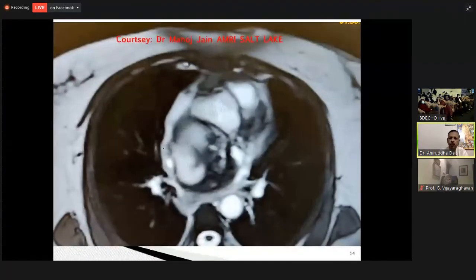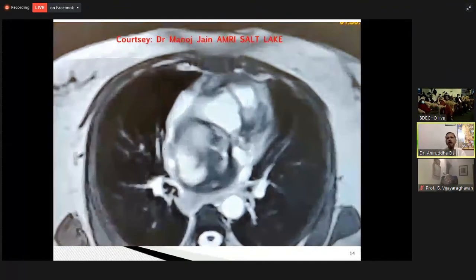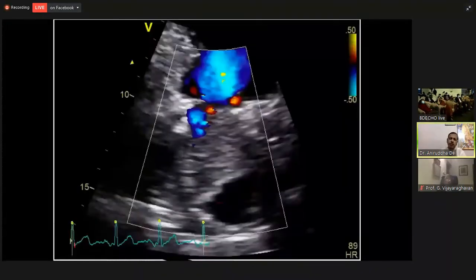Before going into the CT scan, we thought about the possibilities from the echocardiography point of view. We thought there must be some mass, it could be a myxoma with cystic degeneration or any other LA mass. We could not exactly make the diagnosis, but this was the working possibility. Keeping this in mind, we did not do the transesophageal echocardiography. We went for a good CT.